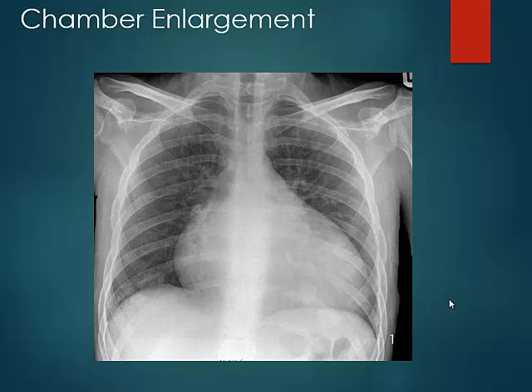Okay, tell me about the ventricle. Focus on the ventricle here. Which ventricle is enlarged? Right. Why do you say right? The apex is extended. Is that a feature of right ventricle enlargement? No, I said the apex isn't. If the apex moves to the left and inferiorly, that's a sign of left ventricular enlargement, as the apex is formed by the left ventricle. So this patient predominantly has left ventricular enlargement for whatever cause.